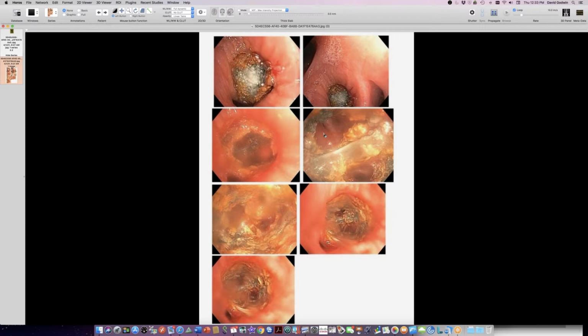Awesome. Hey Dave, we don't see any or many lung transplants here. Can you comment on what you think of her symptoms? You said that she only felt some rattling, right? Like, so they've altered sensorium, I'm imagining, after transplant. Well, I think she probably had stuff gurgling around this thing, and as you breathe in and out, there's probably some gurgling of secretions trapped behind this thing, and that's what she called a rattling sensation.